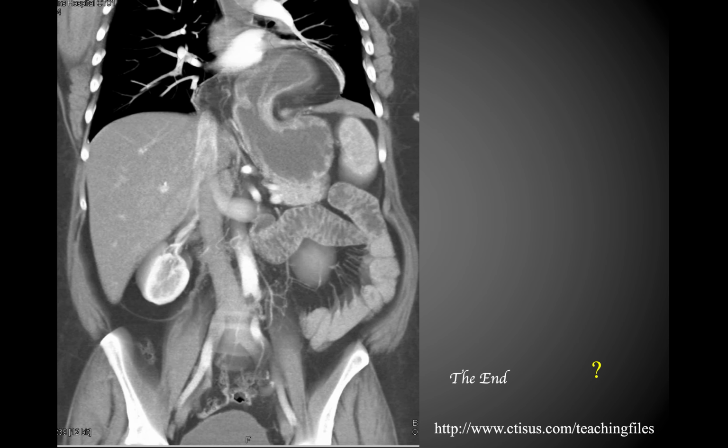And then finally, I'll give you a second to look at this. This is a coronal CT scan, and you can hopefully appreciate a fair number of anatomical structures here. You can clearly make out the IVC and the aorta, the pancreas coming across, or it's actually probably part of the jejunum right there. And then this down here is going to be the descending colon, spleen, and then this is the stomach. So notice the stomach is up here in the thorax, so it's gone past the diaphragm. So this is an example of a hiatal hernia. It's actually a really good example of a hiatal hernia.